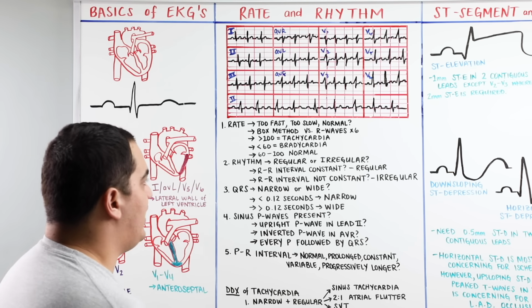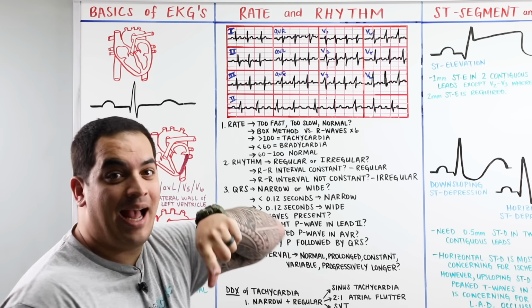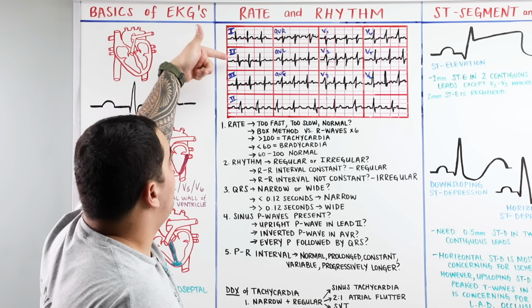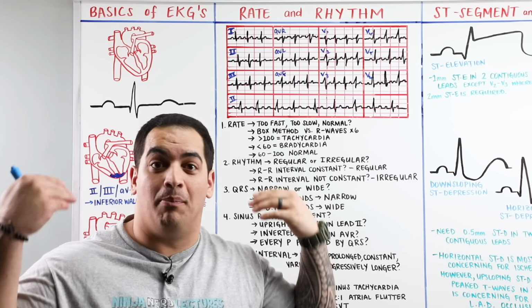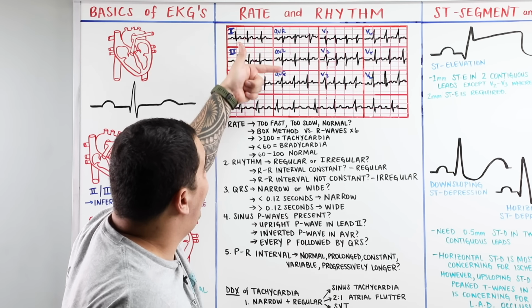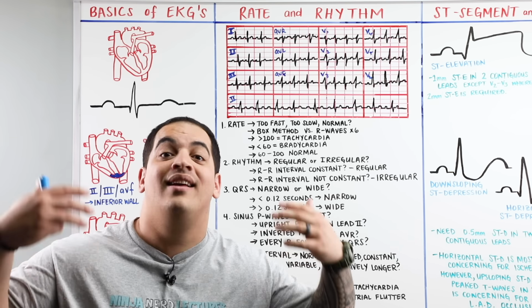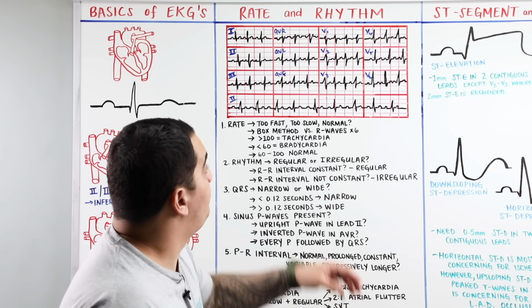So before we start doing that, let's take a look here at this makeshift 12-lead EKG and really quickly recap what we talked about in the basics. 1, 2, 3, those leads are what? Your bipolar limb leads. Tell us about the vertical plane. AVR, AVL, AVF are going to be your augmented unipolar limb leads. They tell us about the electrical activity in the vertical plane.